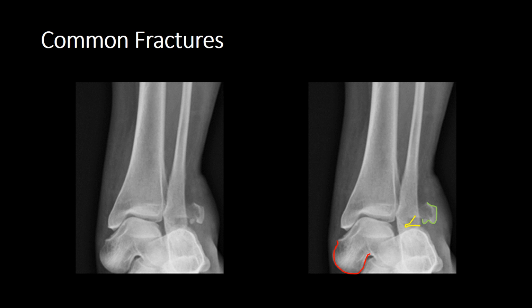I love this image. We can become completely distracted by the rather large fibular fracture and then fail to assess the rest of the image. If you do, you're going to overlook really significant injuries, such as this example. You need to use your search strategy AABCS in order to carry out a full evaluation. If we look carefully, we can see that the head of talus isn't articulating with anything. It's completely dislocated from the navicular.